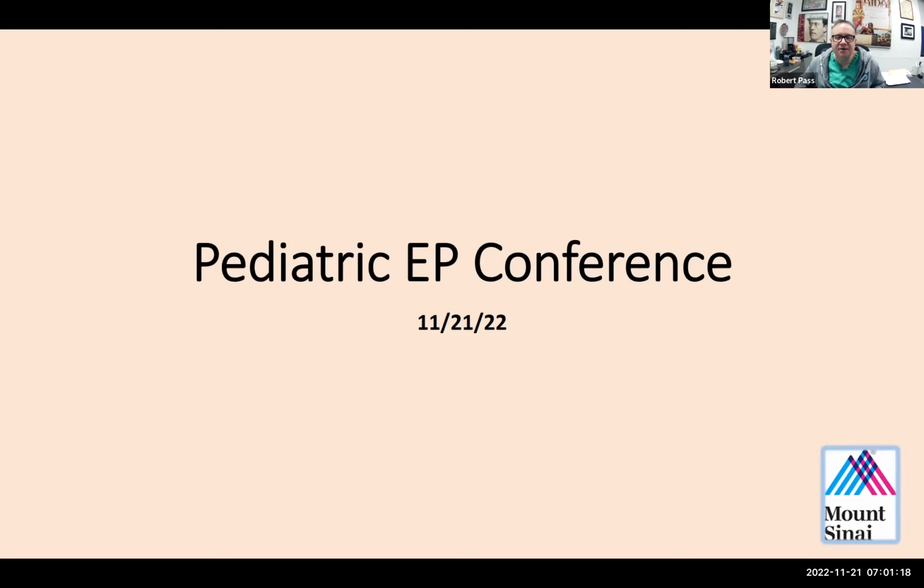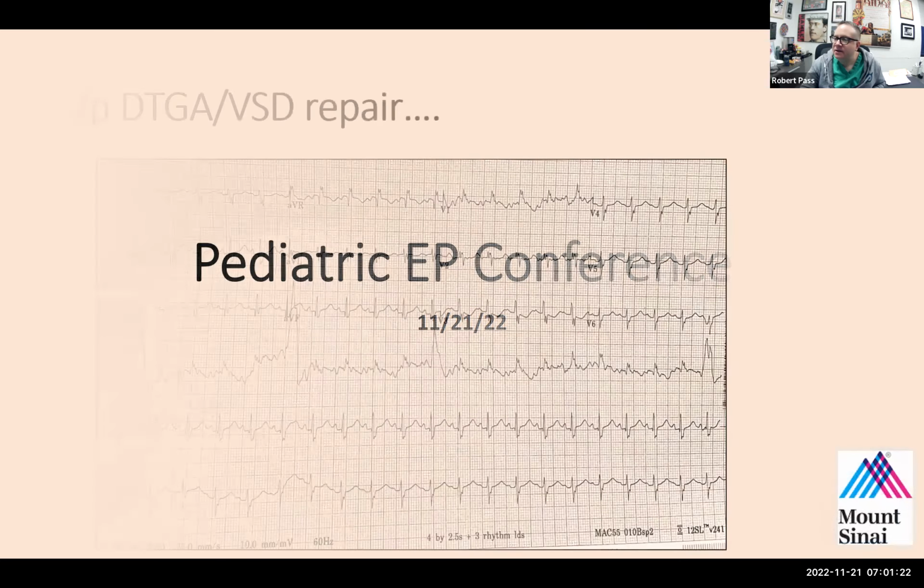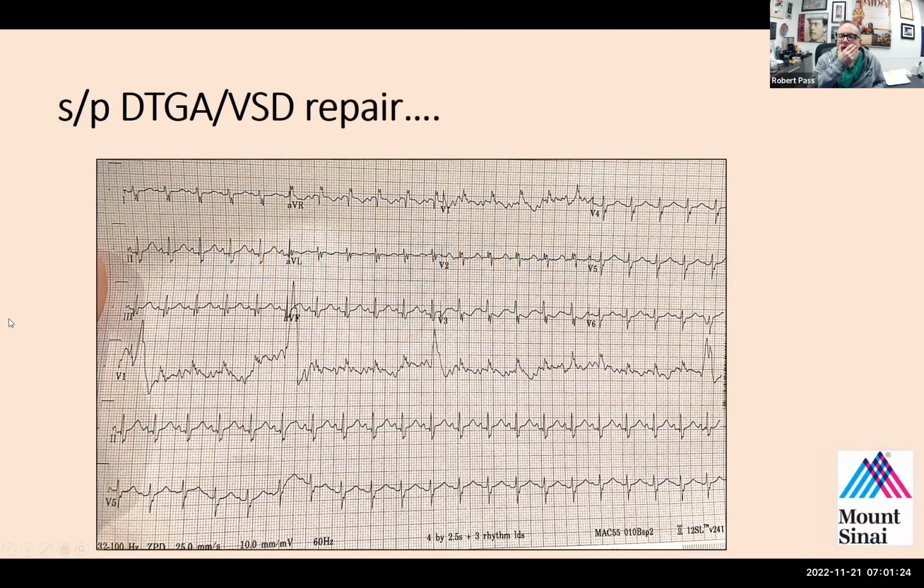Okay, I guess we'll get going. It's a short one today. So this is a tracing from a patient who had transposition VSD repair. And this is the 12-lead electrocardiogram that was obtained after surgery.